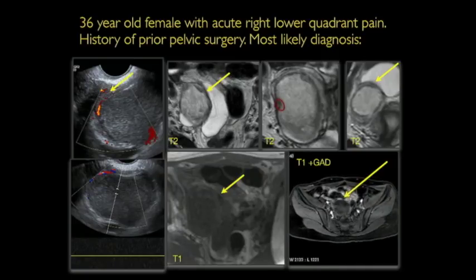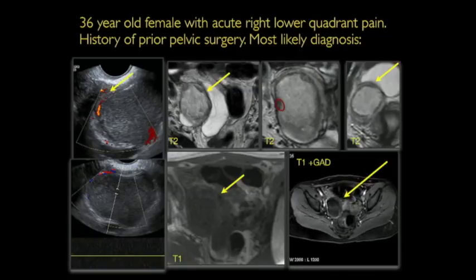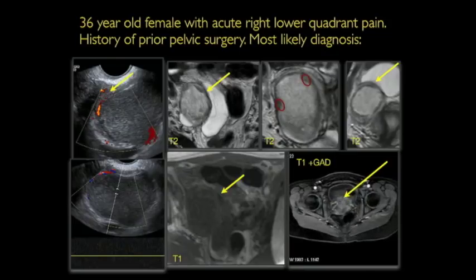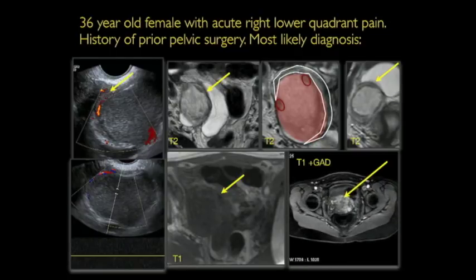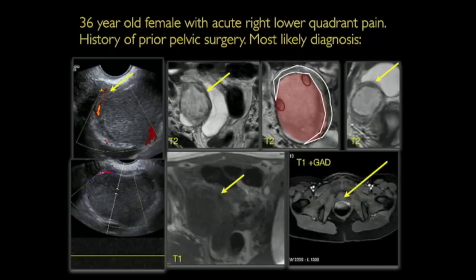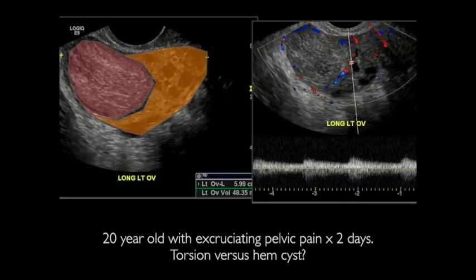And other subtle things you could see really beautifully on this MR: you see the one dominant follicle, which has hemorrhaged. It has these little follicles in the periphery because it pushes the others aside, as well as the hemorrhagic cyst, and then that stretched ovarian parenchyma. So these are the key findings when you're looking at both MR and ultrasound. And here's a little bit easier example. Here's the hemorrhagic cyst and a beautiful claw sign from the ovary dealing with the hemorrhagic cyst.